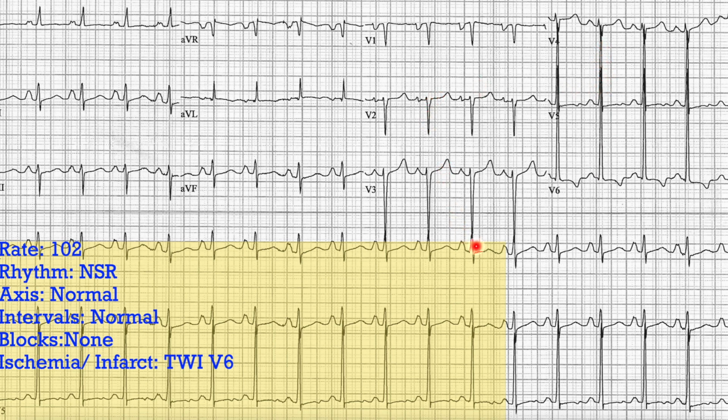Likewise, if you look at these, the QRS here goes down, that S wave goes down and touches the complexes in the next strip. That's sort of a poor man's sign that this is probably LVH. Now, if the heart is right up against the wall of the chest, sometimes you can get these big complexes, or in young males or skinny folks, but this is pretty pronounced. There are also criteria you can apply for LVH, but I can never remember them.